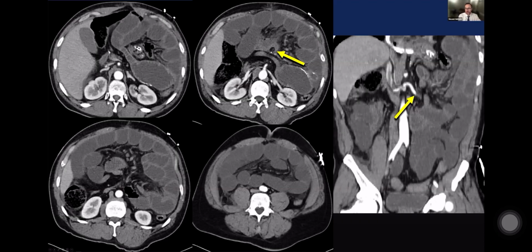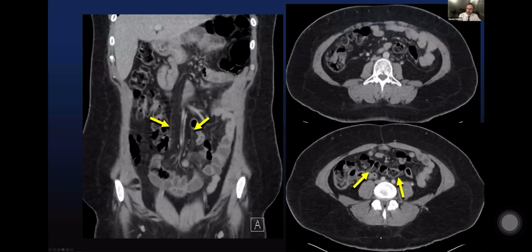And honestly, this is a case where the anatomy of this internal hernia, which is what it was, isn't actually that clinically relevant. This person has a high-grade small bowel obstruction with volvulus, with vascular compromise and occlusion. This is a trip to the operating suite, and this happens to be a transmesocolic internal hernia, but that detail is less important than identifying the vascular compromise.